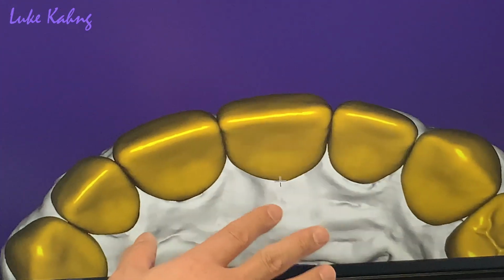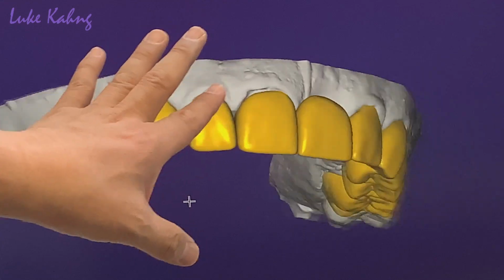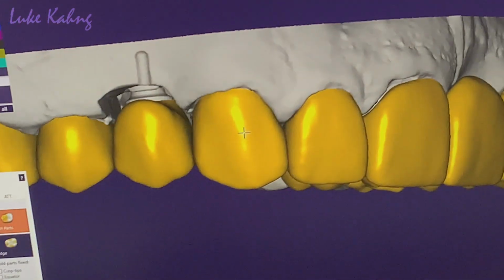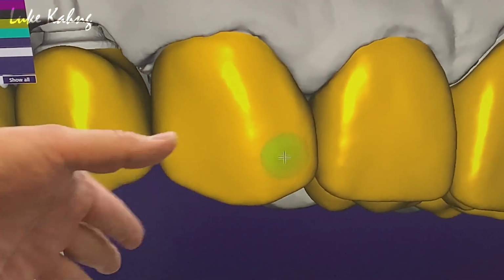Okay, later. Okay, now this is up, sticking out, bringing it. This line angle over there. So what I say is a long axis. Long axis will be here. Move it more, yes. And then slightly add here, in between, concave.